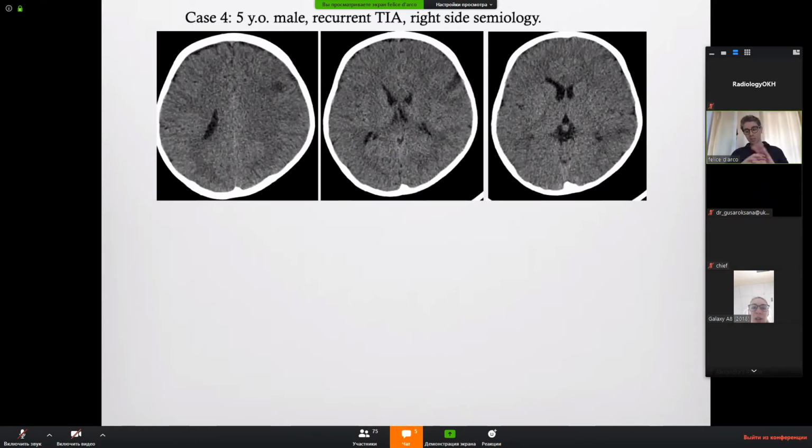So these are the 3 main patterns: parechovirus, white matter; Epstein-Barr, basal ganglia encephalitis; herpetic encephalitis from herpes simplex, sparing of the basal ganglia, limbic system, mesiofrontal region. Now look at this. This is very, very important again as pattern recognition. There are plenty of patterns describing viruses and other infections, but I'm just giving you the main important findings in terms of pattern recognition.